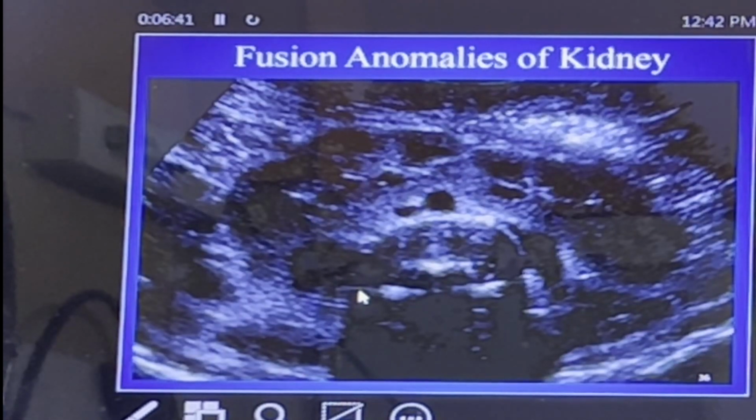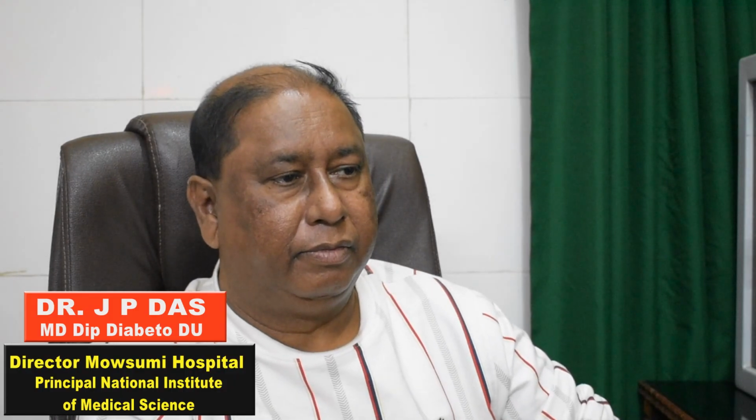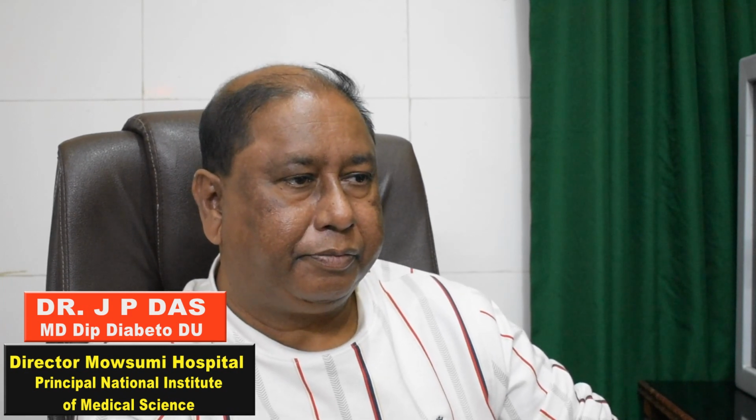What you look at in this picture is a horseshoe kidney. This is a fusion abnormality of the kidney, two kidneys fused. This is the commoner form. There is improper ascent and malrotation.